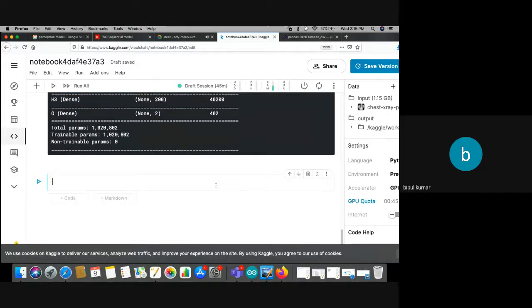We can train our model with the help of some, now I will add one more parameter over here, that is called learning rate. Learning rate defines the speed of learning. So like you asked me, what is fine tuning? This is called fine tuning or hyperparameter tuning. That means we are now tuning the hyperparameter called learning rate.